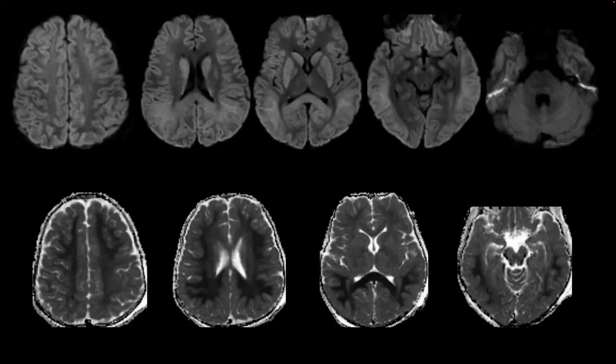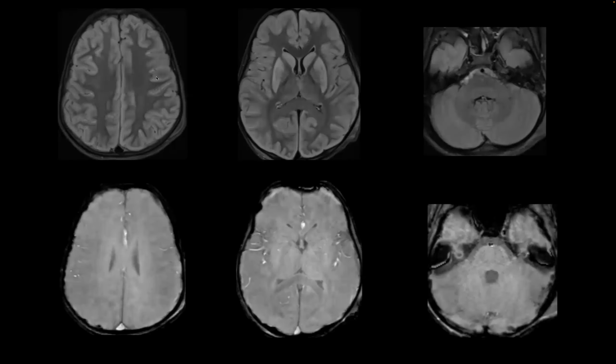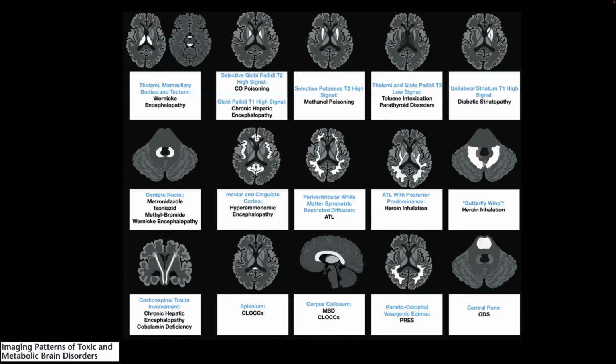But again, you have predominant confluent white matter abnormalities, predominantly in the peripheral regions of the cerebral hemispheres on both sides. Corresponding FLAIR edematous changes: the white matter is slightly hyperintense. Also, the deep gray nuclei, that is the basal ganglia, demonstrate these edematous confluent changes. No hemorrhage or calcifications on the SWI sequences. And given these imaging findings, the possibility of a toxic etiology was considered.